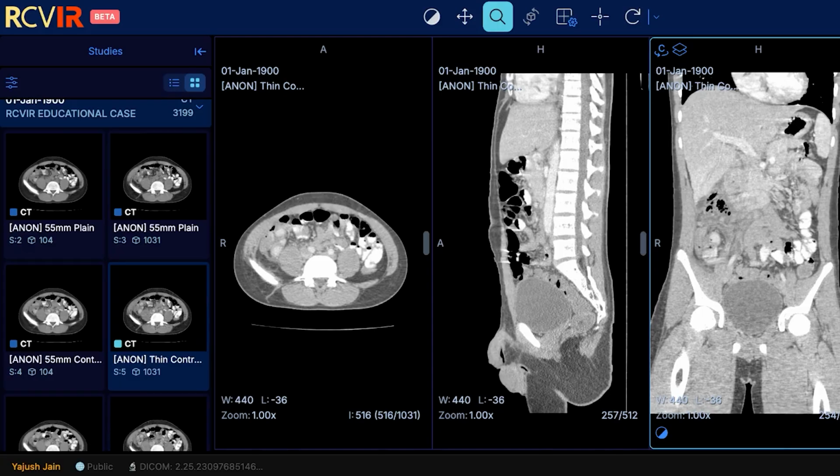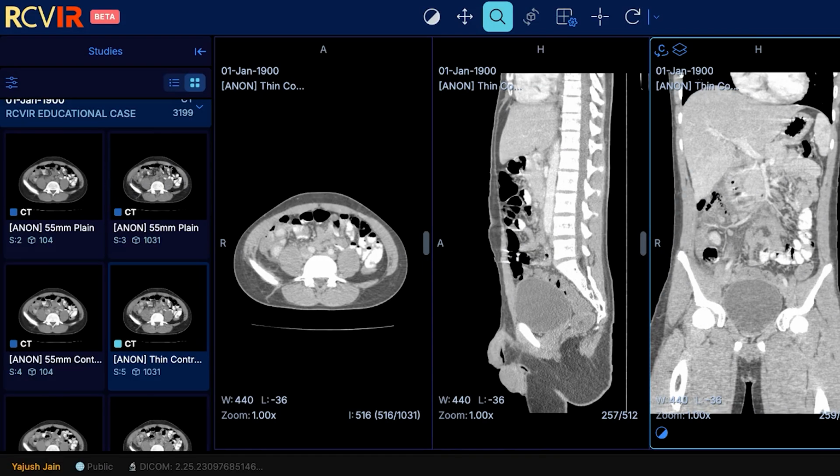Okay, so the takeaway point here is that a sudden relief of pain, especially in a patient with appendicitis, is a surgical emergency, and it is not a cure. You will rarely see the perforation itself. To find the traces of air, switch to the lung window and check in the most non-dependent spaces like the subhepatic region or the anterior liver surface. Then jump back to the abdominal window and see if these free air particles are surrounded by the bowel loops or not.